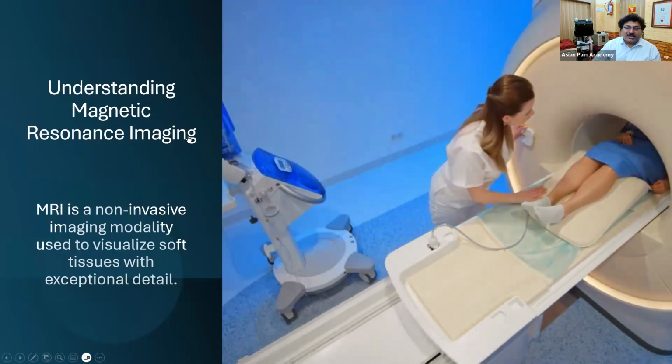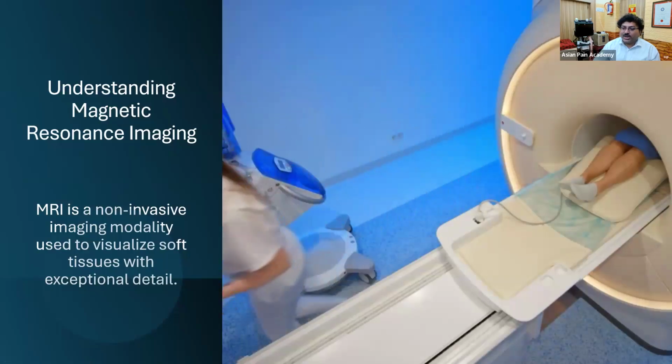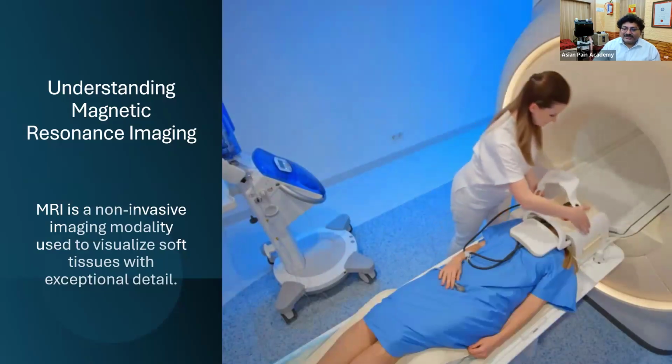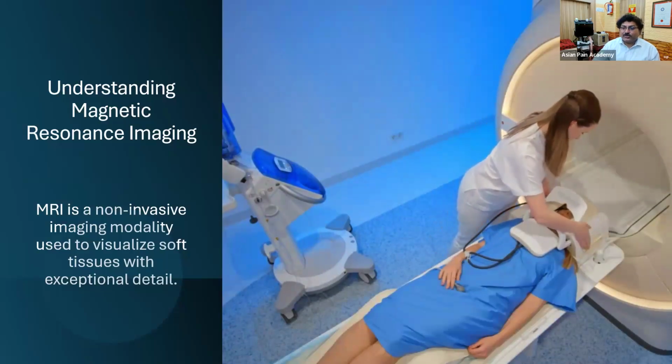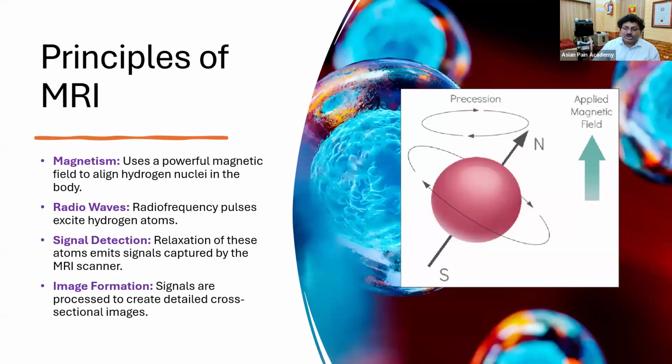Now coming to understanding MRI, because MRI is very crucial for understanding cervical and lumbar spinal structures. X-ray gives very limited information about the spine, whereas MRI gives much more detailed information. So what is the basics of MRI? The basis is magnetism. It is a high powered magnetic field, powerful enough to align the hydrogen nuclei of the body.